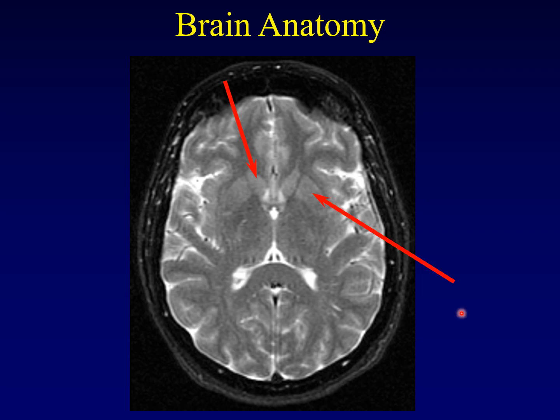How about these things? Here I'm looking at this object. If you look closely, you can see me outline this almond-shaped object and this sort of elongated triangle here. What are those? Well, those are the basal ganglia, right? This is gray matter, same color as that stripe of gray matter around the outside. This is gray matter that is embedded deep within the brain.